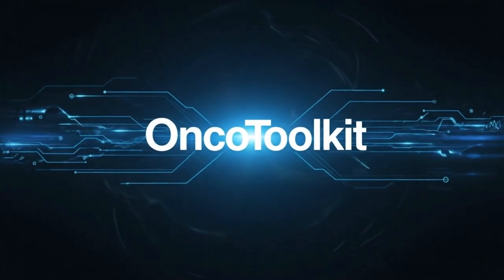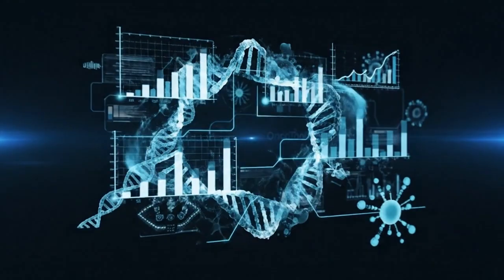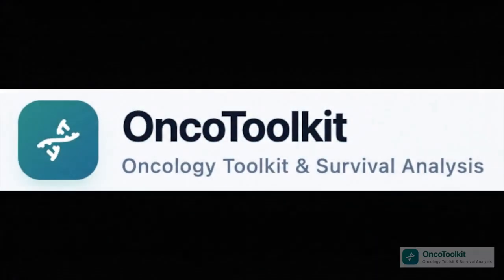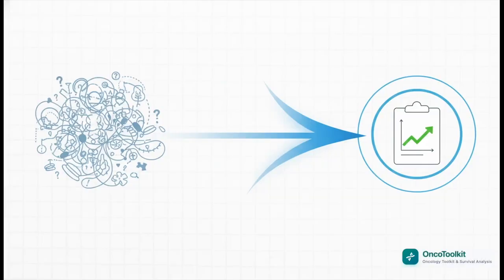Rapid access to comprehensive oncology data and survival analysis. This is the Oncotoolkit. Look, if you're a busy clinician, you know every second counts. You need to get from complex ultrasound findings to a clear, defensible management plan right now. And that's exactly what this is for.